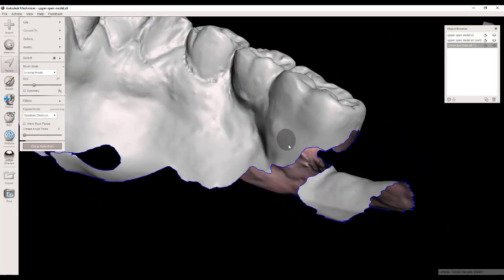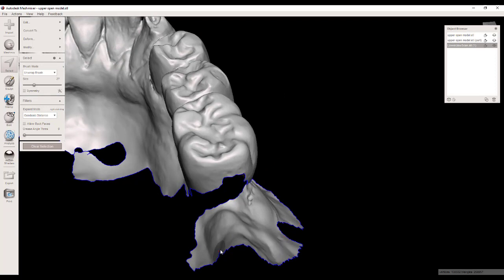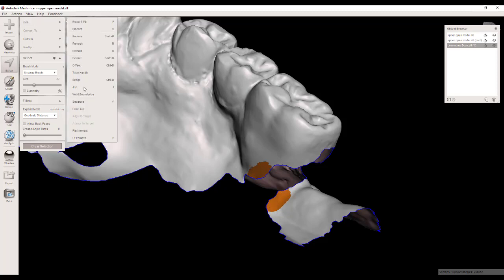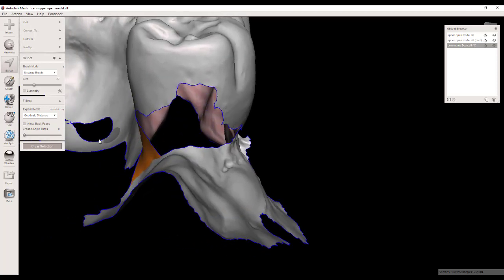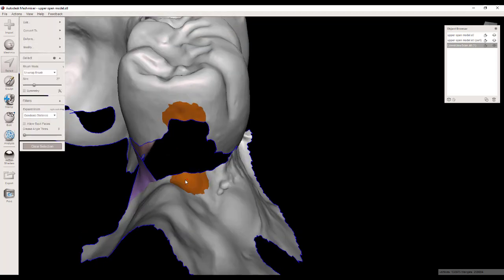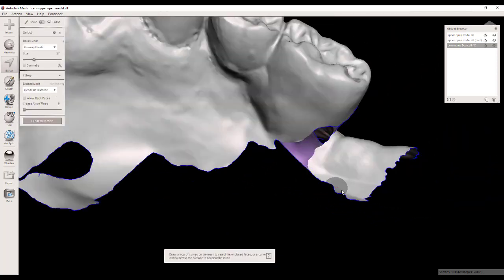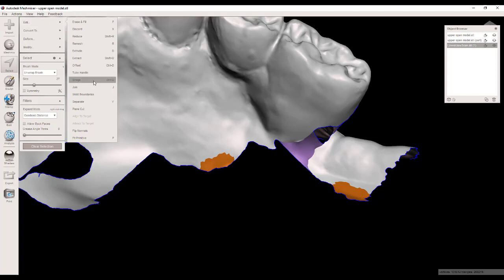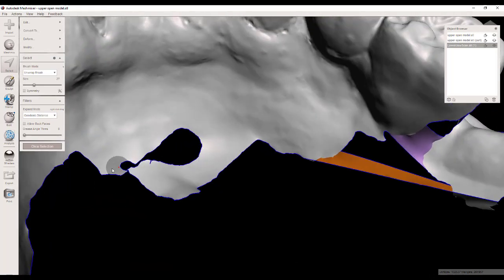This is a really prime example of where you would need a repair, because what are you going to do? Cut away all of this area and lose it? Obviously you don't want to do that, so let's just close that in. So edit, bridge, we've closed that. If you worry about this not filling in completely, then you could capture another area, edit and bridge. So we're just going to go around the model and perform this on any of the boundaries where they're rough and they need closing in. Can accept that. Great example here.